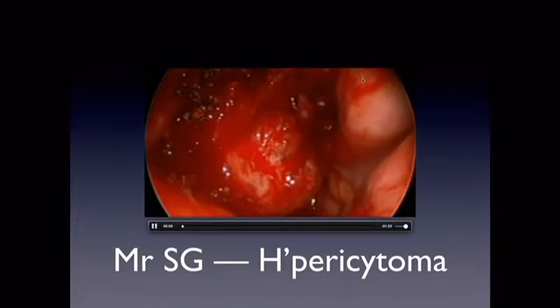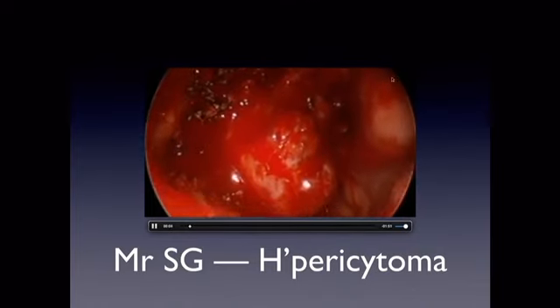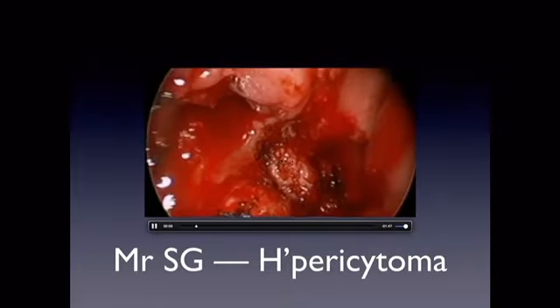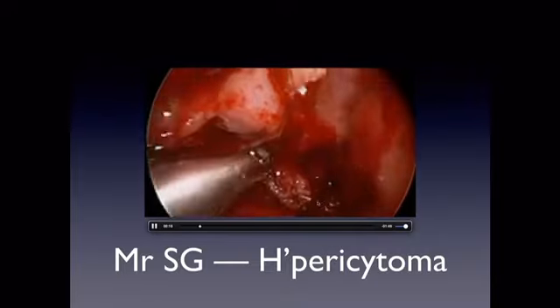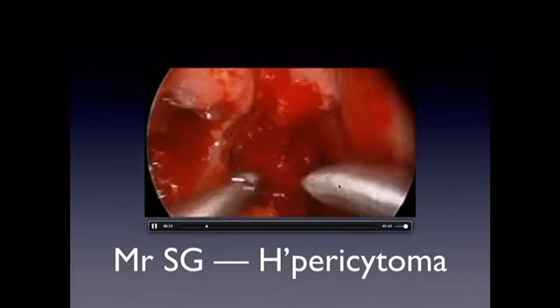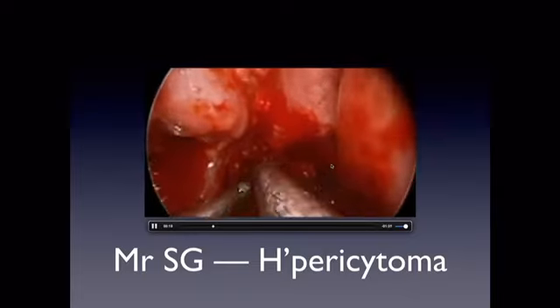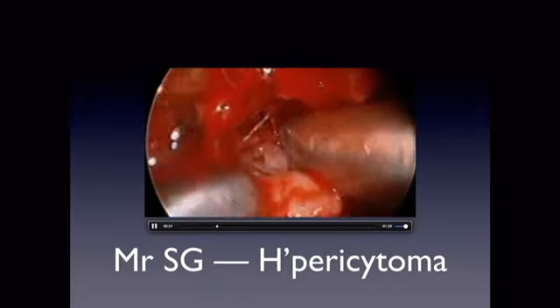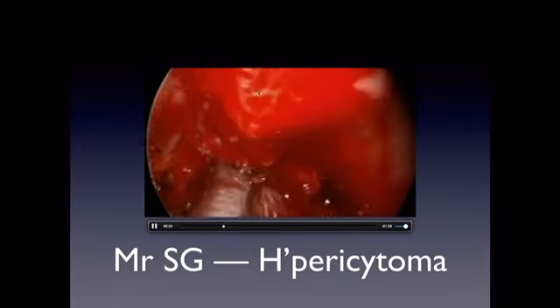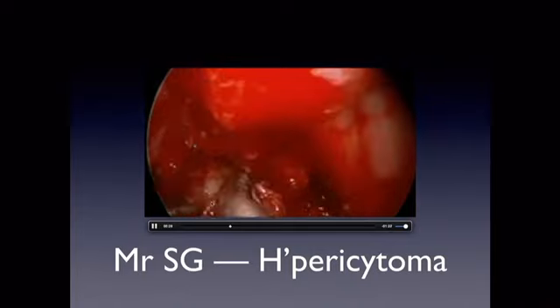So this is that area. So this is midline. This is looking to the left nasal cavity. There isn't a left and right. There's just one single nasal cavity. Now looking towards the back where the sphenoid sinus is filled by that tumour. And on the scans, one of the other things we had to appreciate was is there a layer of bone underneath the internal carotid artery, which there was in the sphenoid sinus, but there wasn't anterior to that, just as we saw that lateral bit going to the middle cranial fossa, the anterior part of the cavernous sinus.